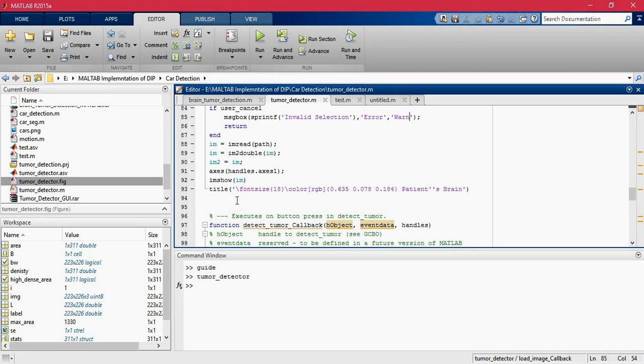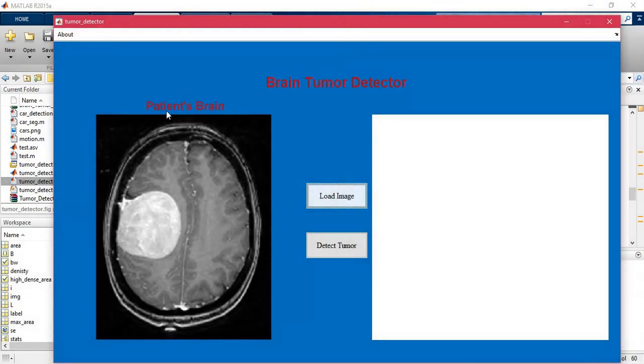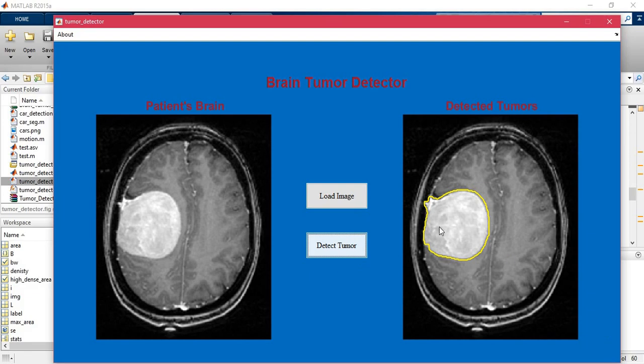And show it. The title, just to make it appear nicer. You can leave it as it is. I made here double quotes because if you make only one, it will do like this. So you have to put two. And if I run the code, you will see that here, patience, it's only one single quote, not two. That's right. Here is the tumor as well.